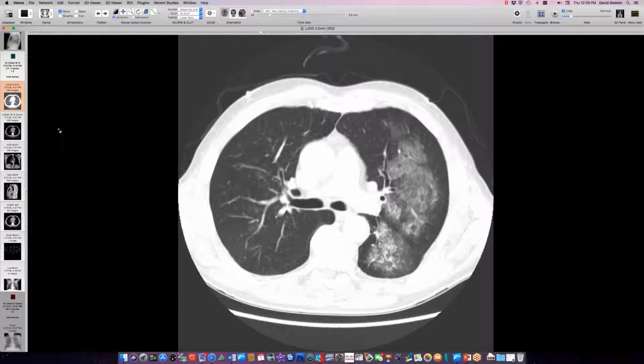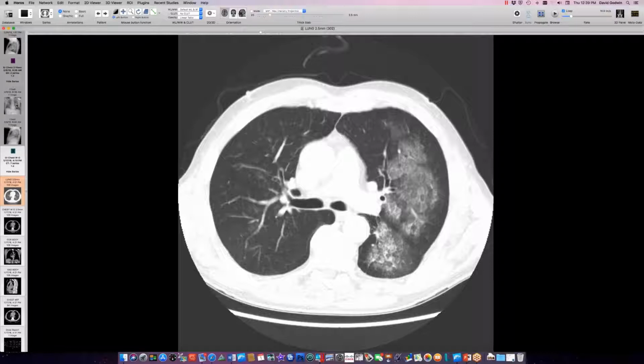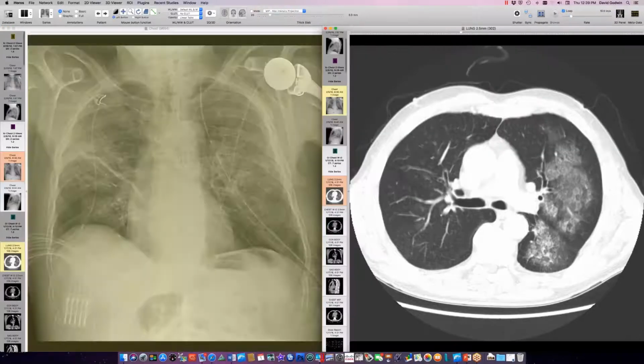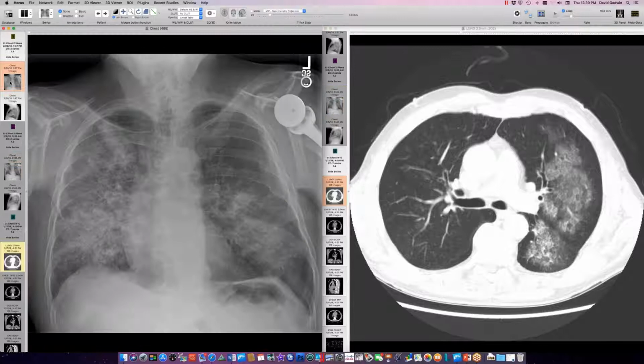He was coughing up a fair amount of blood, but he got better. In mid-February, you can see that his radiograph has cleared to some degree. Then he came back just day before yesterday with a new round of hemoptysis, and this is on no treatment. Now he's got much more consolidation, particularly on the right, but it's moved around the left base. So, recurrent hemoptysis in this person.